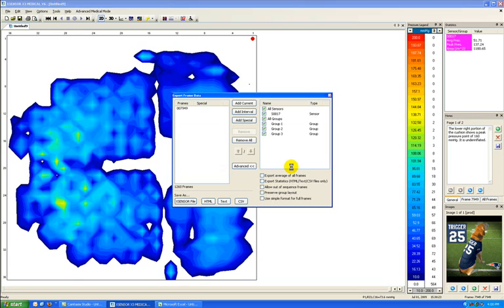So it's going to pick out those frames for me, and then I'll get the data specific to those frames and those groups that I defined earlier. So in the end, I have 3,476 frames that meet that criteria.